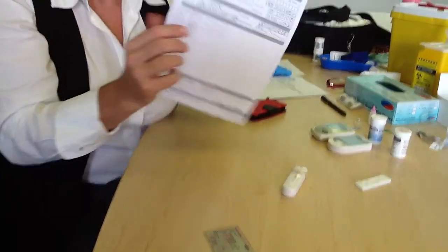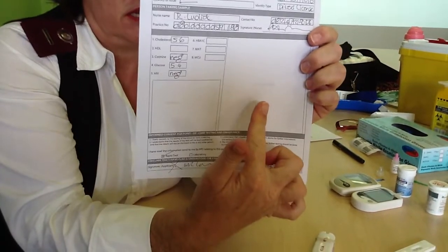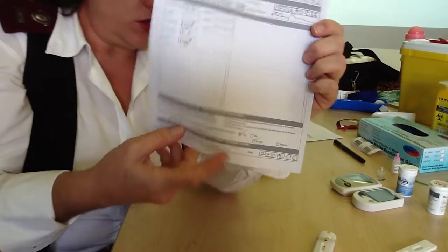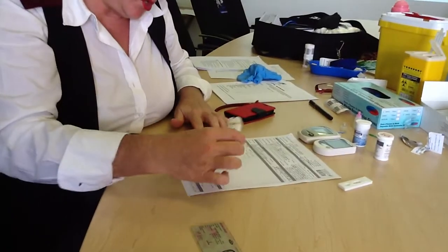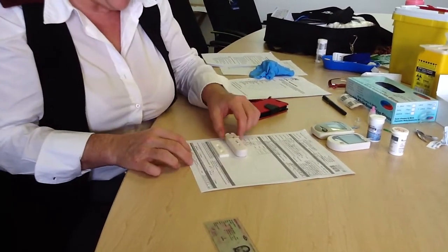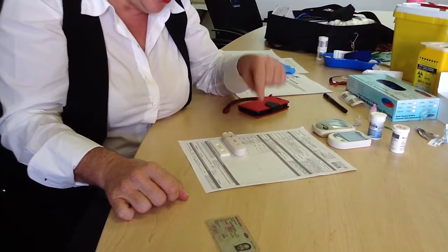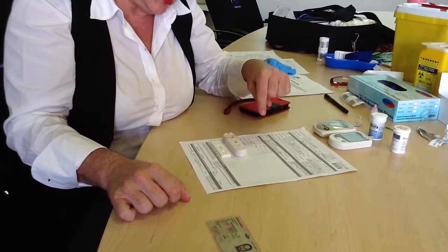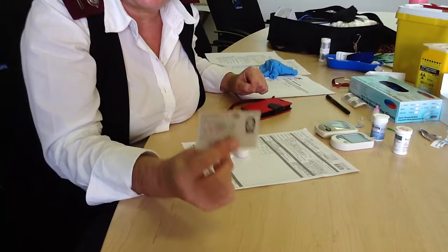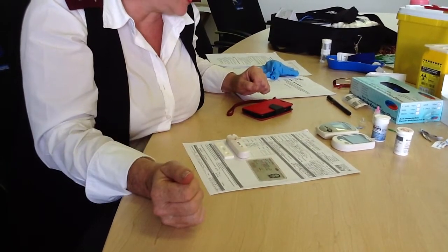If you look at your lab form, you will see that there's a block that says rapid tests. There's a block that says ID or identification or ID driver's license. You're going to use those two blocks now. You're going to put your rapid tests on the block that says rapid tests, both your HIV and your cotinine tests. So they will go in that block neatly, not covering any of the writing or signatures that you've got on your document, please. You'll then take your patient's or your client's identification document and you'll put it in the little block that says identification document.